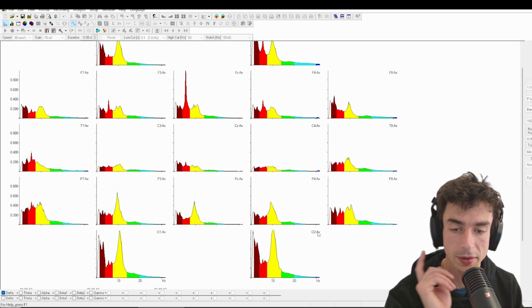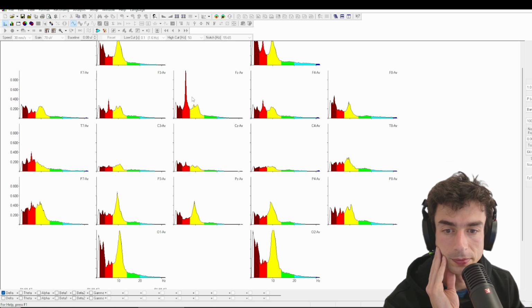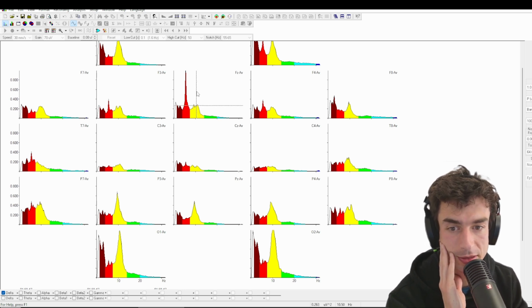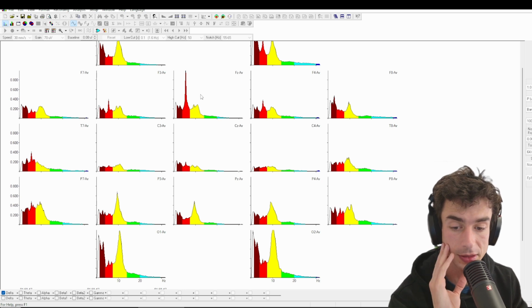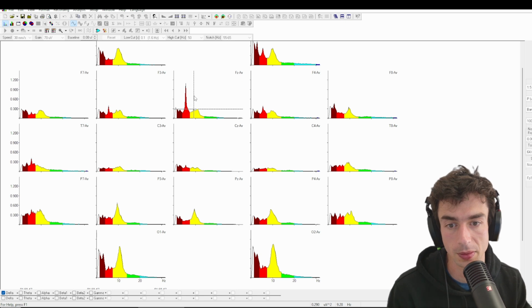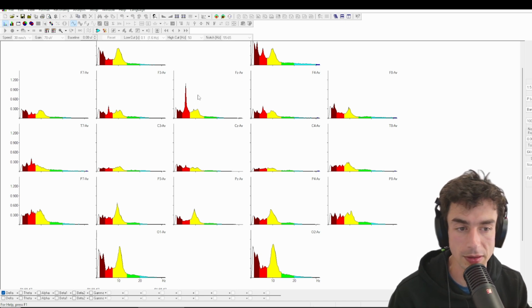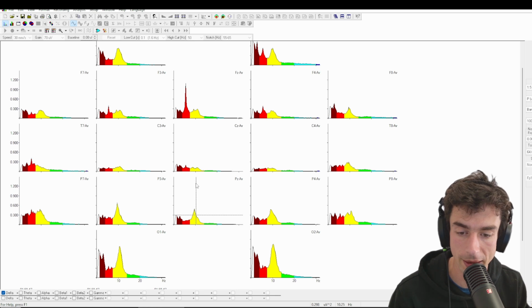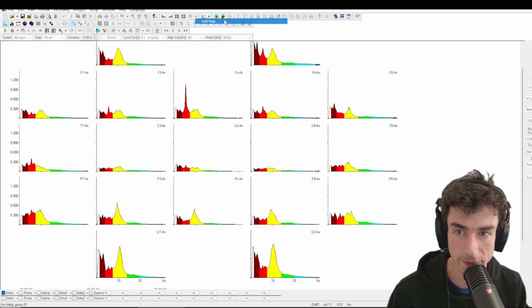And if anything, I'm struck by just how much alpha there is up front because of the drowsing, essentially, and the poor alpha tuning. So that's also a sign of vigilance regulation issues, potentially, even if at the back of the head it's okay.